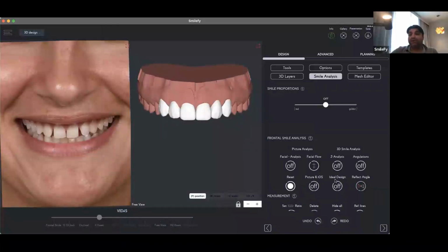That's a beautiful book and a beautiful study from one of our dear mentors and pioneers of smile design, Galip Gurel, the smile analysis. And now we see the angulations of every single tooth by just clicking a button are different: 13.1, 11.3.